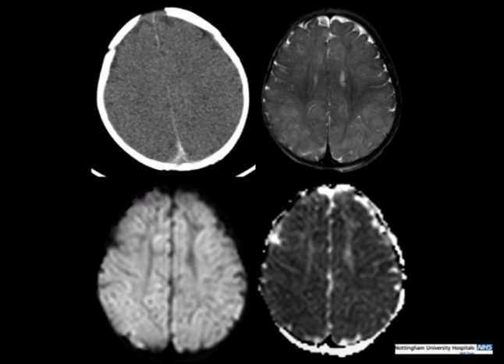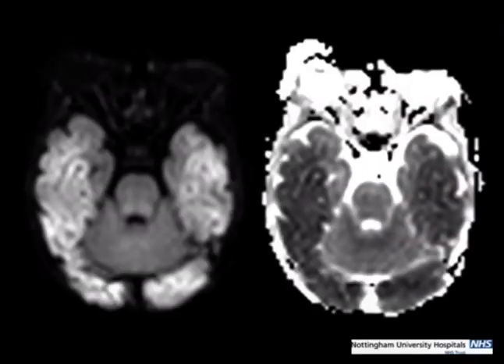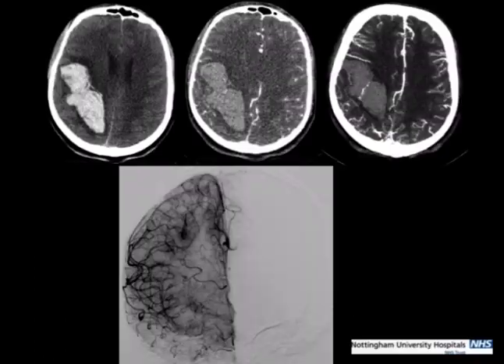There's definitely some abnormal hyperdensity posteriorly. The T2, again, not really right, but if you're not used to looking at it, can trick you. Diffusion's nothing obvious really standing out until you look in the posterior fossa. And this is what the normal signal should look like, and it's actually that the whole supratentorial brain is abnormal. So if you can, try and find somewhere that you think looks normal to compare everything else to avoid missing these diffuse abnormalities.